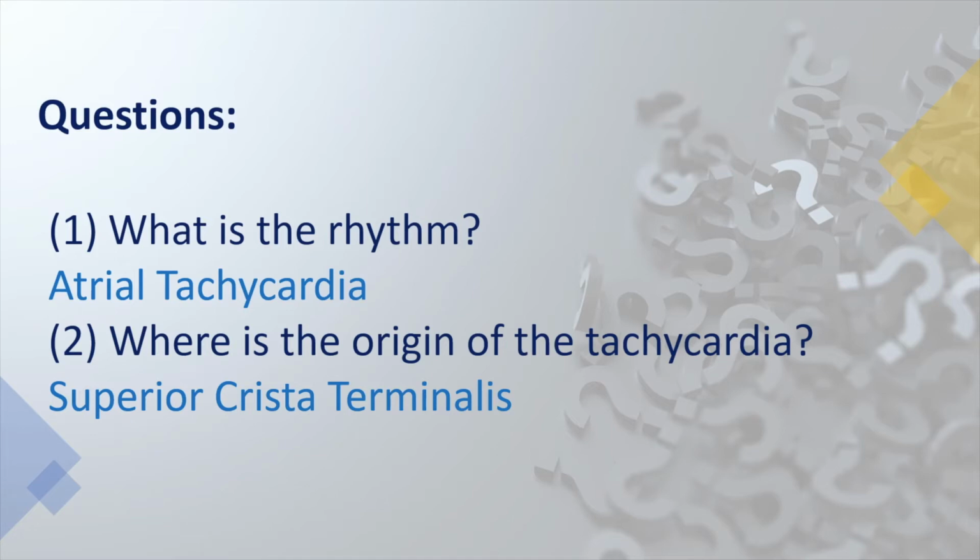Therefore, careful inspection of ECG is highly necessary even in patients with irregular ventricular activation to rule out a regular atrial rhythm with decremental conduction properties of the AV node as potential differential diagnosis for atrial fibrillation.